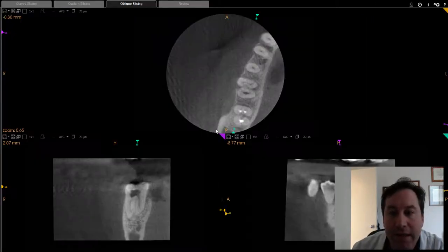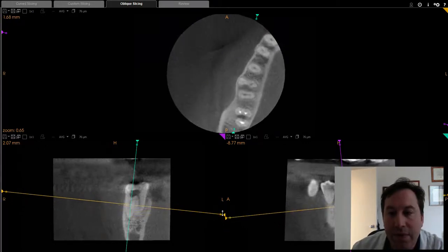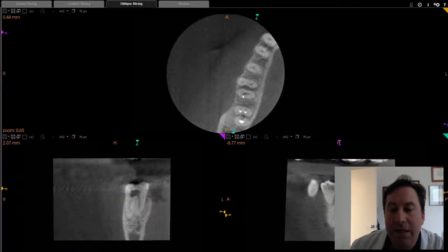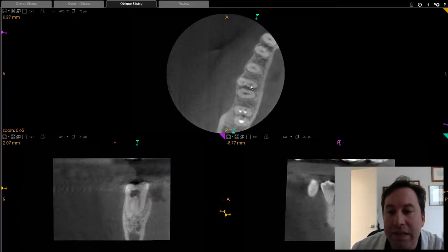We'll go through a CT scan over here. Just going to go through the volumes. And first thing we notice when we look at this case is that the distal canal has an ovoid shaped configuration, and the distal lingual aspect has really not been cleaned out properly. You can see here the distal buccal has that circular orifice indicating the case was instrumented, but the distal lingual really has not been.